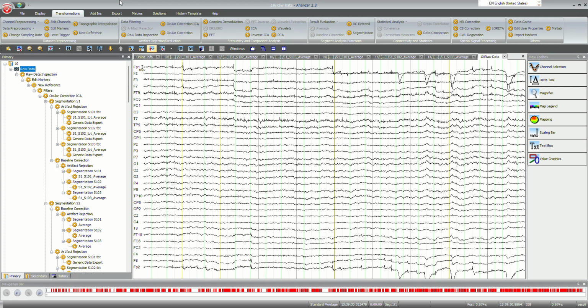In our case, we're going to create these plots in BrainVision Analyzer, and for this purpose, we want to make a grand average that summarizes our data across participants and across trials. So basically, that's a grand summary, collapsing across multiple repeated measures.